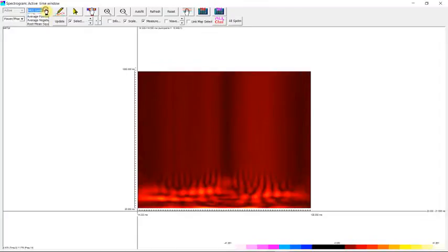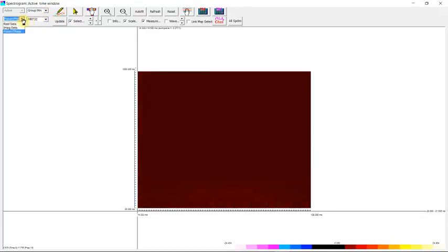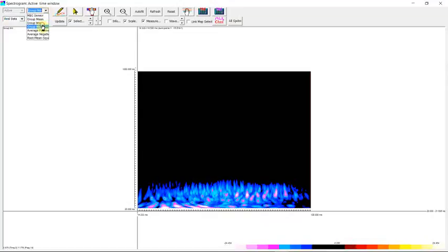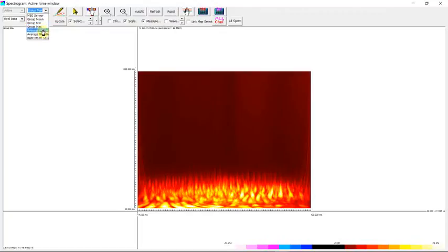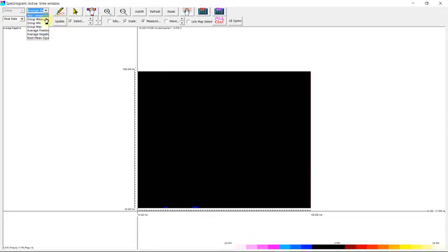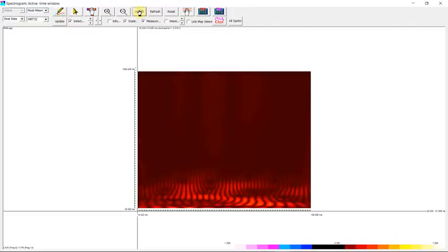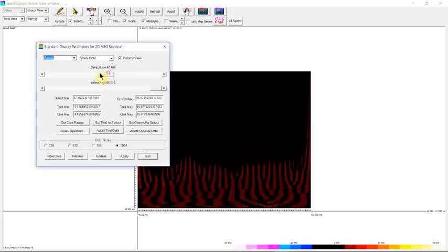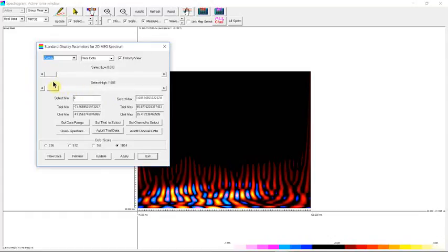We can see the group, that's with all the sensors. If you think it's not good, you can see the minimum value. Of course, for power, you can see real data, and you can see the maximum value. You can see the positive value, see the minimum negative. If you want to make the fusion better, you can change this ratio field. You can change the area.